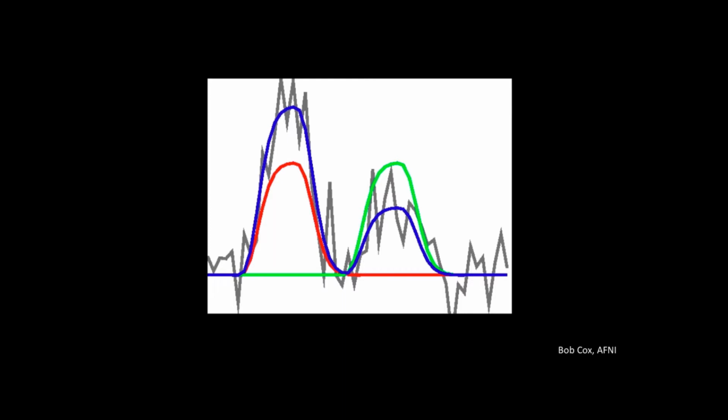The only thing that's weird is that we have these time series and then people get kind of tripped up about it. But all we're doing is we're trying to match this raw signal pattern with our ideal model pattern, right? And we fit it with all these beta weights to try to get the best fit.